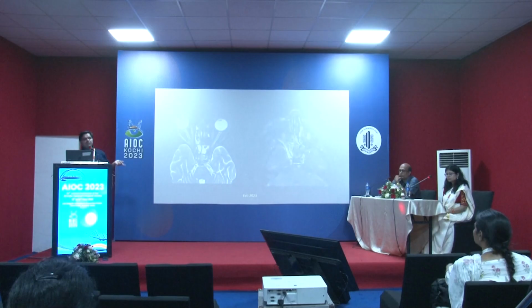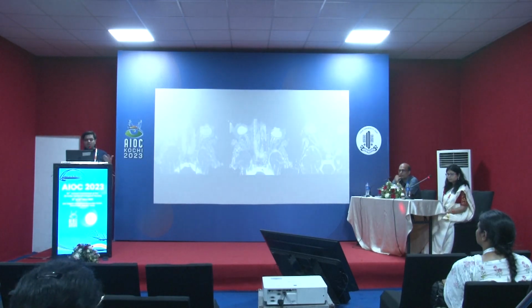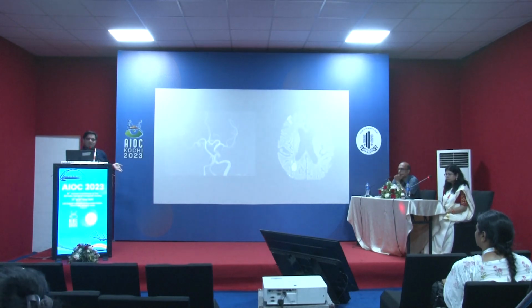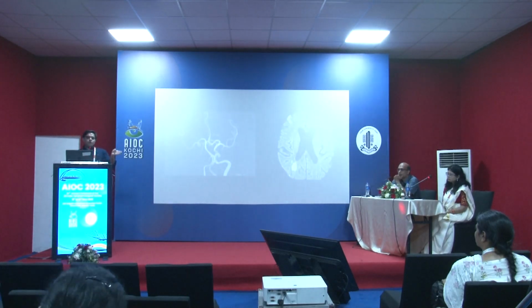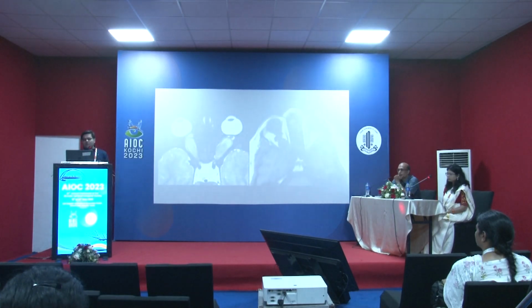Despite treatment in February, from December to February, it worsened, involved the cavernous sinus, and thrombosed the ICA. So this is the diffusion restriction as it changes, becoming worse and darker in the apex and the cavernous sinus before creating an infarct. So we have to be really careful with these. There's nothing that I can say apart from image earlier rather than wait for 2 months if your patient is not responding. Do it earlier to show the change of fungal signal in the orbital apex, because that happens.